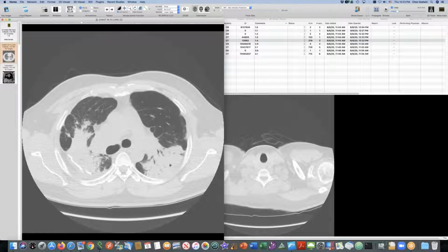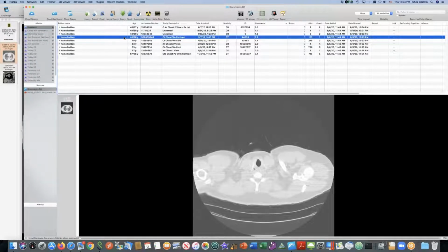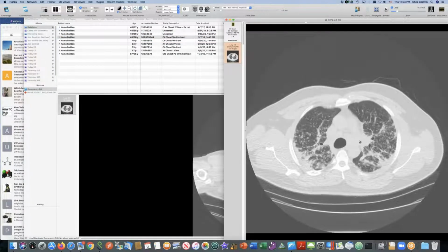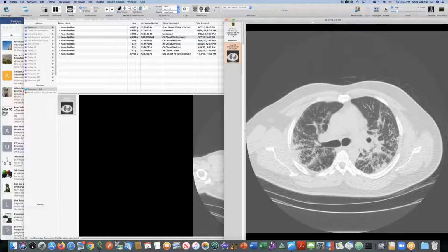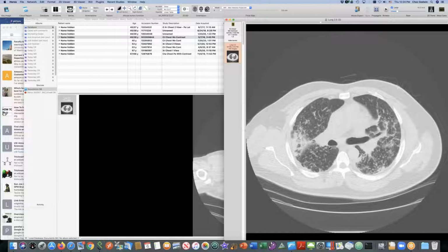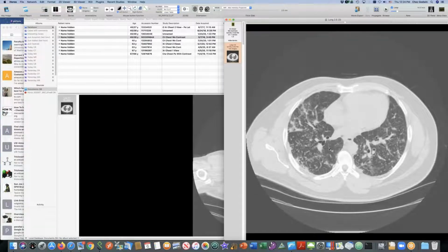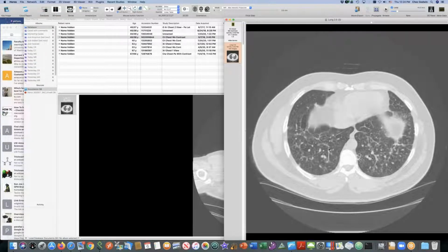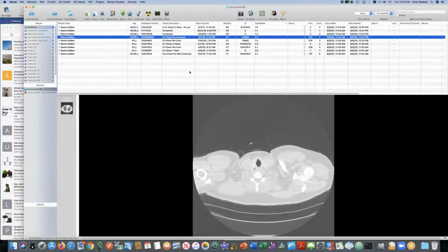And so this dense consolidation up here. Let me show you his earlier CT from 2018. This is 2 years before. And you can see at this point, it was primarily fine nodular disease with some beginning conglomeration, but mostly small nodules. Those small nodules have now all been sucked up into these conglomerate masses. So this is rapidly progressive silicosis from this very potent exposure from countertops.